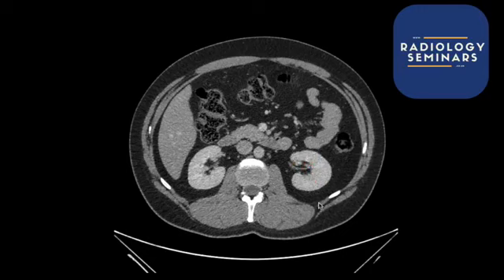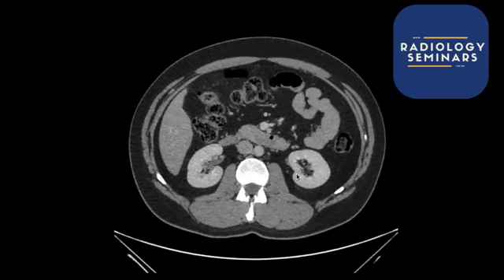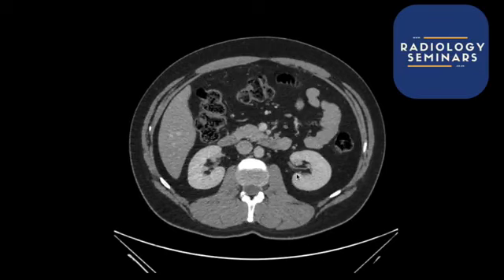Be careful though, because sometimes people can have parapelvic cysts, and they will actually be more spherical. They won't join with each other, and that can confuse a lot of people. I've seen patients who have had multiple scans trying to figure out why they've got hydronephrosis, and they've just got parapelvic cysts, and they've always had them. In that situation, previous imaging may be useful, ultrasounds can be useful, and sometimes you might need to do a different kind of scan to figure out what is going on with that patient.